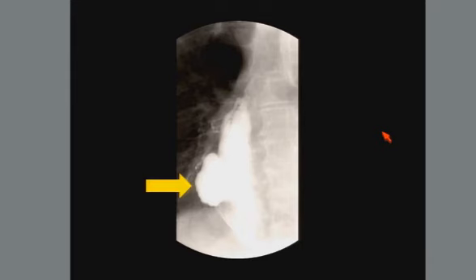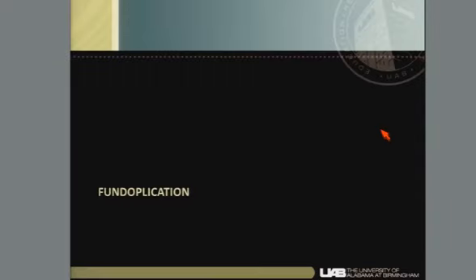We saw this large ulcer in the stomach that was created by the stent eroding through that gastric wall. And unfortunately, they also still had a communication with the airway. So the endoscopist placed a second, slightly more proximal stent, and this patient did fine, but you can still see that large ulcer crater from the stent.